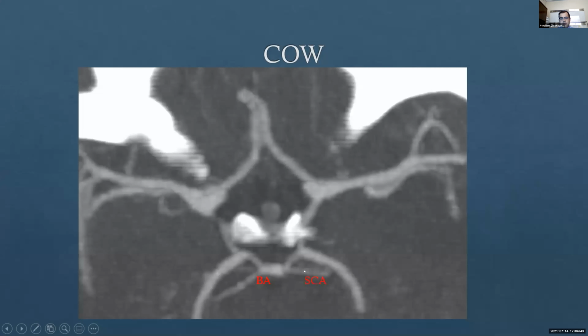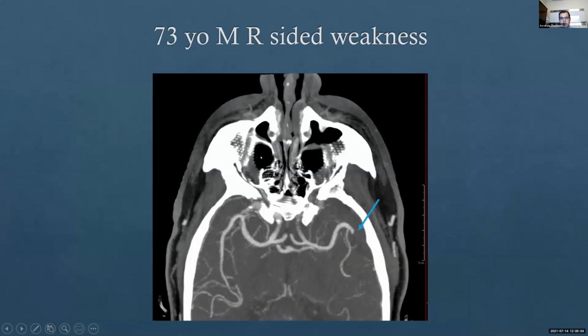This is the superior cerebellar, don't worry about that. These are the posterior cerebral arteries. This is what we call the middle cerebral artery, and the anterior. The posterior communicating artery is the connection between the arteries in the front and the back, critical. And this is a connection between these two anterior cerebral arteries. Okay, all right. Any questions?